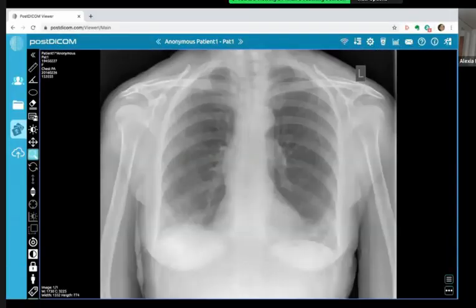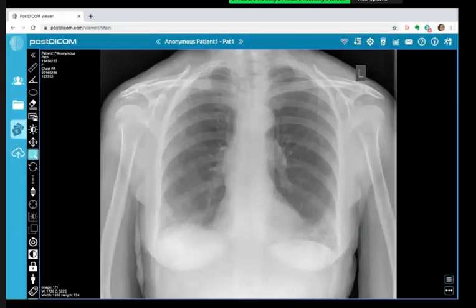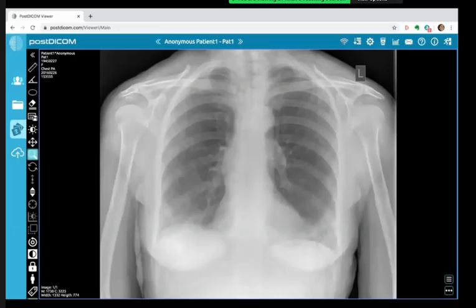It's a frontal chest radiograph of a 75-year-old lady with increased work of breathing, which is demonstrating bilateral low zone reticulonodular shadows, more predominant on the right side, involving the costophrenic angles as well. I cannot see any pleural effusion. Heart size appears normal. Rest of the lung appears normal as well. The bones appear unremarkable on this chest X-ray, and the hila are not enlarged. The normal AP window is preserved.